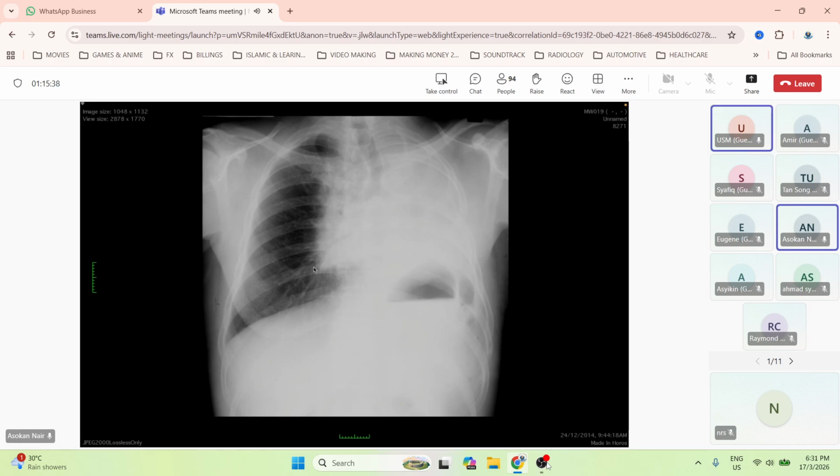So that conforms to a mediastinal radiation port. You see. So if you're not sure, what will you do? I can compare with a previous radiograph. Yes, of course. You compare the previous radiograph and if it looks the same, then you know what it is.